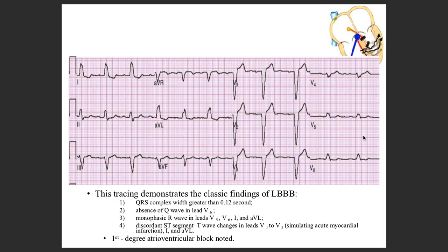So now in this ECG, as I was already telling you, everything has already been written, in fact, over here. So QRS definitely is wider. We do see there are no Q waves. One thing is there, how to say about those Q waves? A lot of times it can be difficult to say, for example, especially in the lead V1.